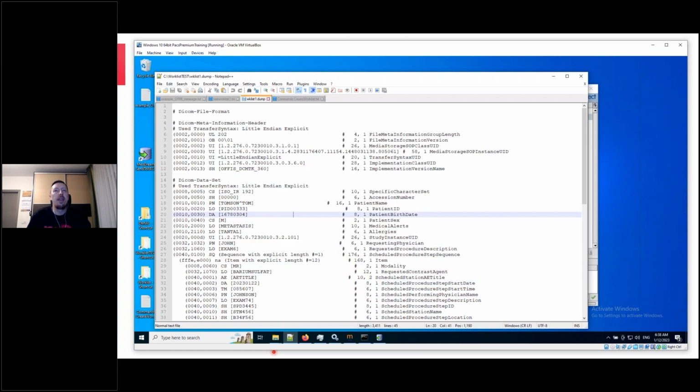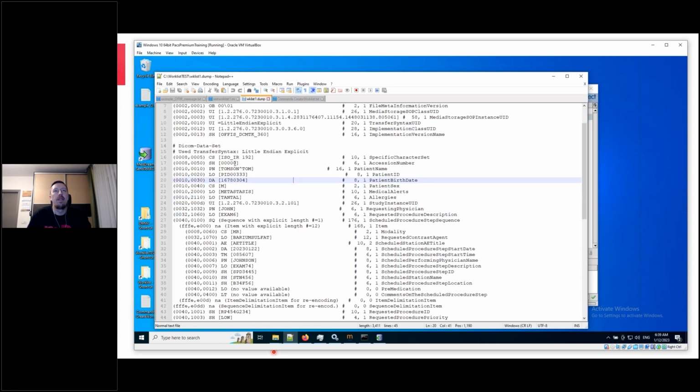There are about 10 examples of worklist files. You can take them, export them to a dump file and check what is inside to get a better understanding of how this file needs to look. So I have this worklist dump file created.